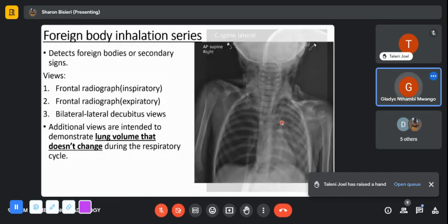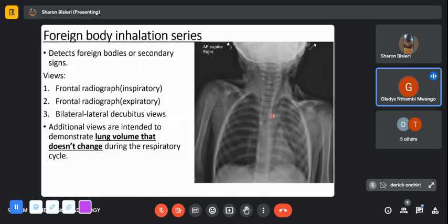In this expiratory image you don't see that continuous diaphragm sign, but there is a pneumomediastinum. I do agree, even in these images you can see those vertical lucent bands.